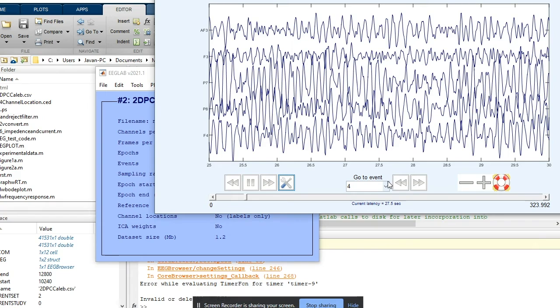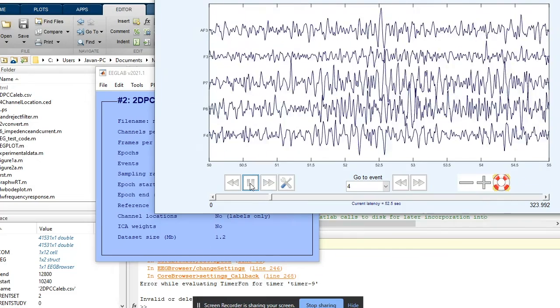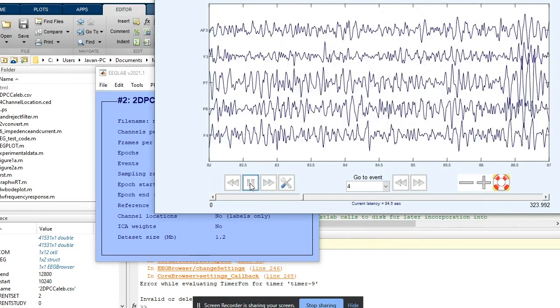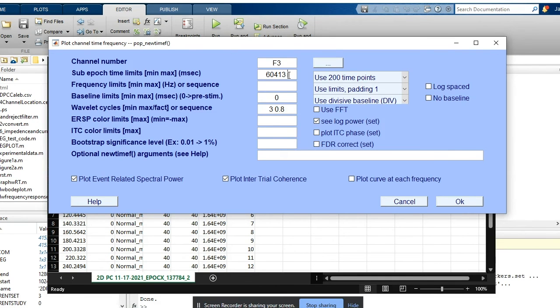After viewing this EEG signal and verifying that everything was correct, this signal could then be processed into another form that could be viewed and observed by observers and the researchers in a very easy to manage way. This would put them inside of a spectrum map that was filtered from a range of 5 to 35 Hertz and placed on particular events.